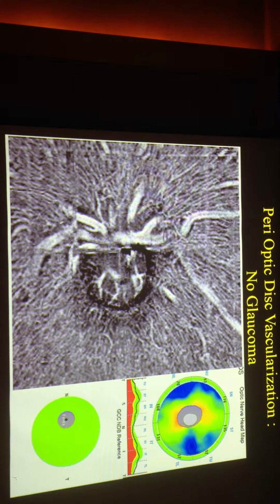And so we have been surprised to see some images you will discover, and you can have different situations. In one, we have a patient with no doubt of glaucoma history, with RNFL normal, GCC normal, no problem with the visual field. We can observe this very dense network, and you can see how these little vessels are close together.